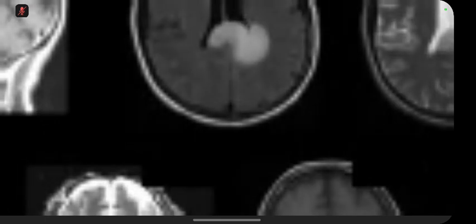Okay, so presented with multiple MRI sequences of a 27-year-old female with weakness 2 months. There is hyperintense signal on FLAIR and T2 that crosses the midline in the splenium of the corpus callosum. On DWI B1000, there is a horseshoe restriction, and that's genuine when mapped with the ADC. And on the post-contrast enhancement series, this does show enhancement in horseshoe configuration. So this is consistent with an active kind of tumefactive MS.